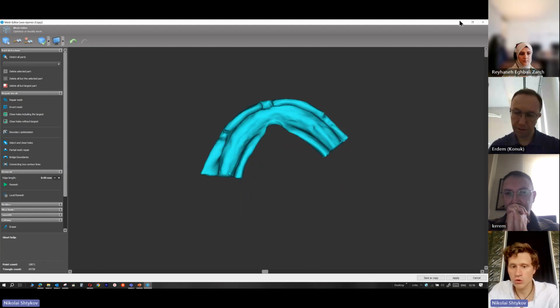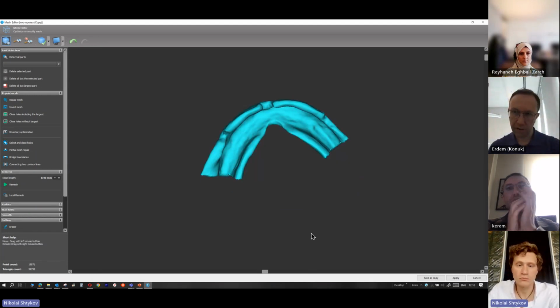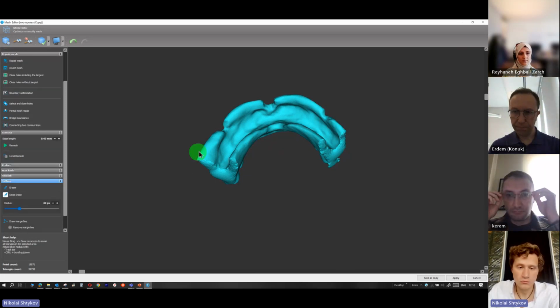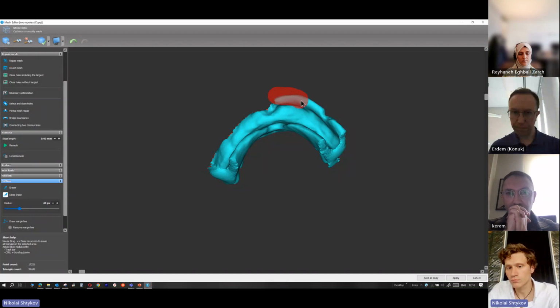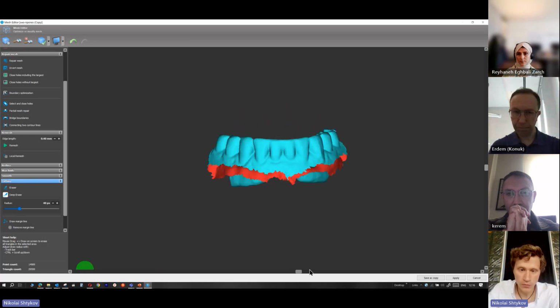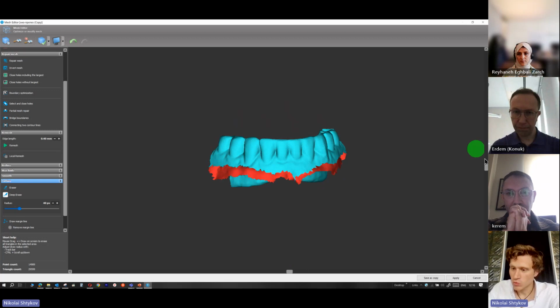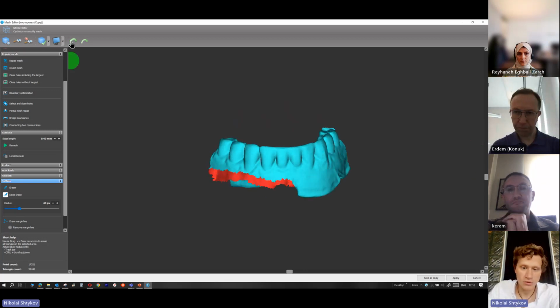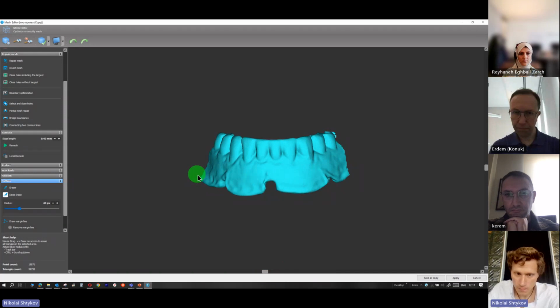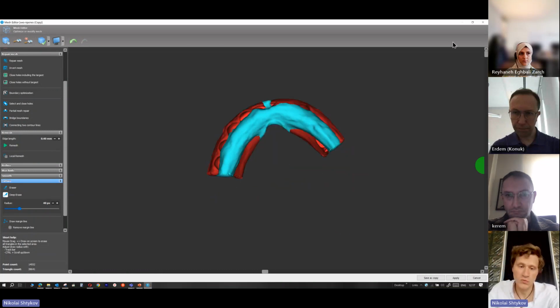And of course you can do it more smooth. No, I don't like it. Yeah, it's okay.